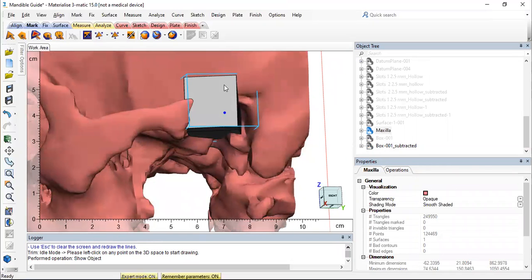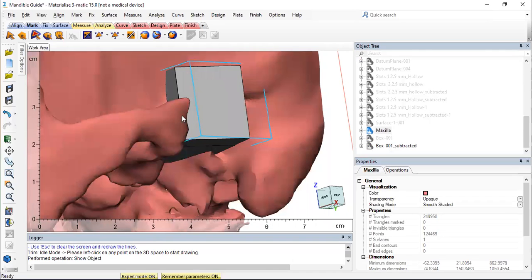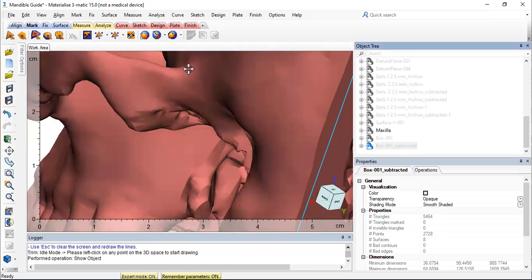कभी-कभी क्या होता है ना कि in some patients that we have noticed that one single box does not fit. आप अगर अलग से surface लेते हैं तो ज़्यादा surface available नहीं होता है fixation के लिए. So that time you can just combine this box and make a surface. Otherwise, what you can do is you can create a surface here using maybe the curve and thing, and you can accordingly limit your surfaces.